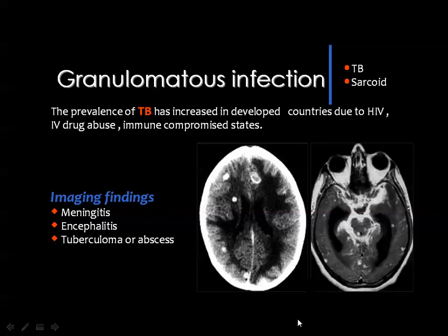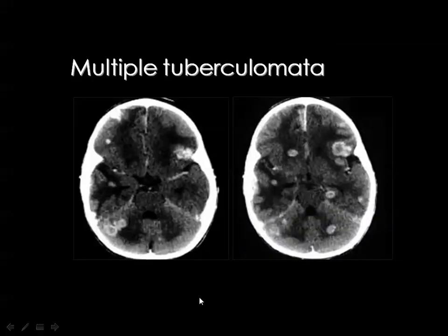The tuberculomas are exactly similar to small brain abscesses, with what is known as the buttonhole appearance. You see, this is a classic appearance of tuberculoma. It is similar to a small abscess with a thick enhancing margin, but the contents are usually relatively hyperdense due to the caseous material inside. They do not contain liquid pus like bacterial abscesses. And this is multiple brain tuberculomas by CT showing the typical appearance, and you can easily appreciate the buttonhole or the thick enhancing ring around these lesions.